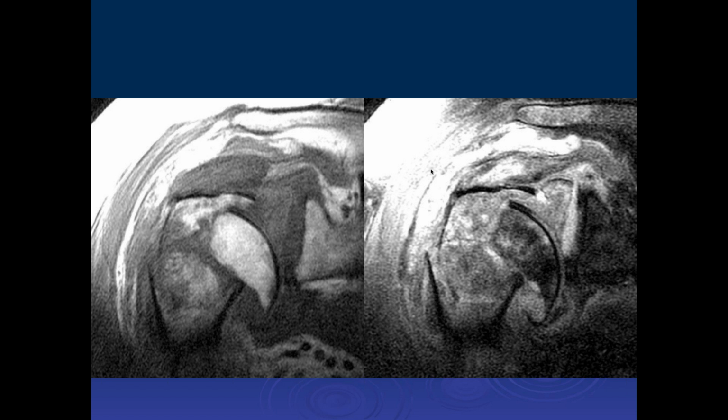So what do you think of this one? All right. So this is a comminuted fracture of the humeral head with both transverse components through the surgical neck of the humerus and a longitudinal fracture plane undermining the greater tuberosity and exiting the superior humeral head. This is probably at least a three-part fracture from what I can see, and it would be unstable. It looks like the supraspinatus insertion attaches to that dominant greater tuberosity fracture fragment. I'd say it's a four-part.